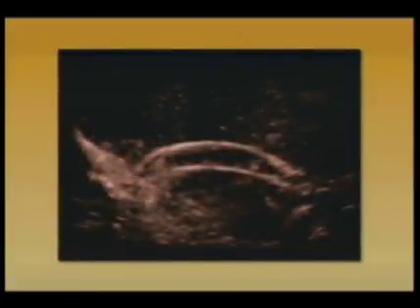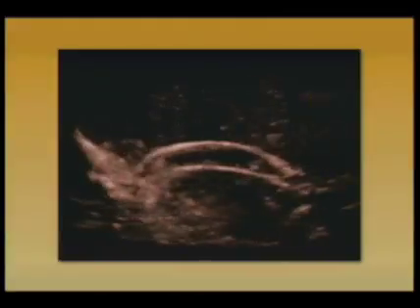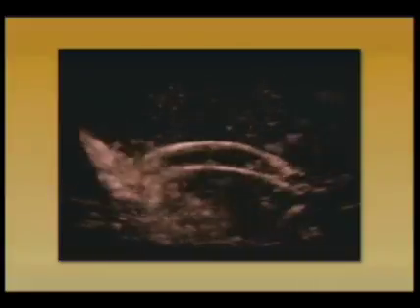Here's another vascular structure, or an artificial vascular structure in this case. It's a TIPS shunt within the liver, shown in 3D. Now we can certainly interrogate these very well in 2 dimensions, both with grayscale imaging and with color and spectral Doppler. But I think doing 3D reconstruction of this case illustrated to me more than anything else ever had the curved pathway that these shunts take through the liver. And as I rotate this, you can see that the echogenic shunt really has a curved path.